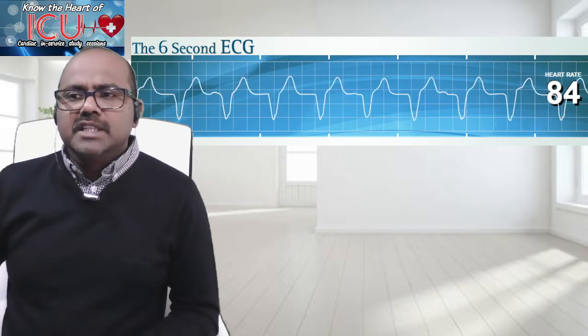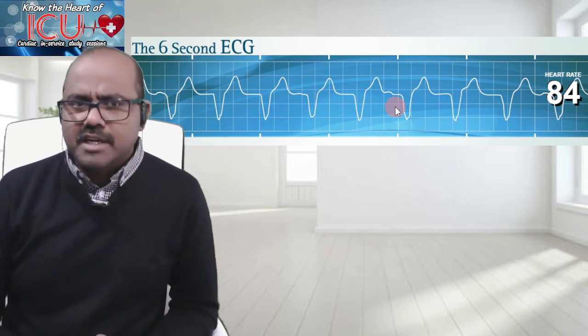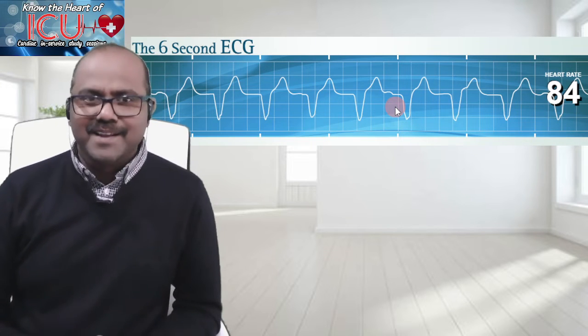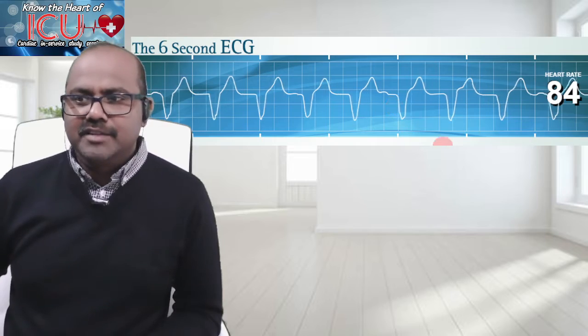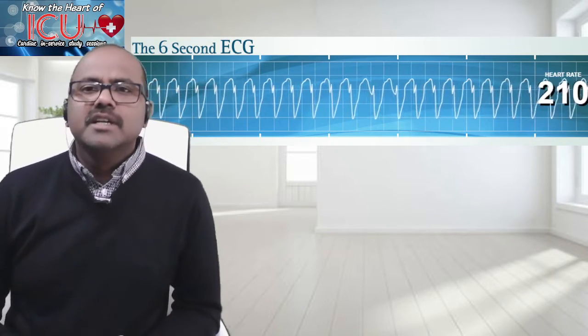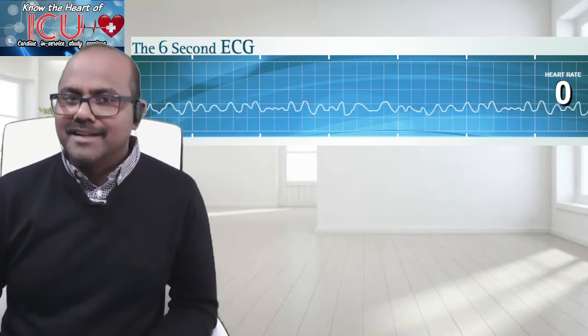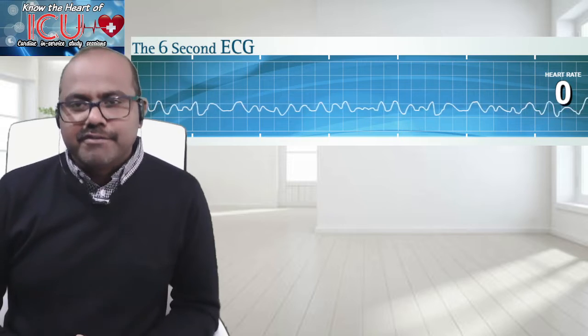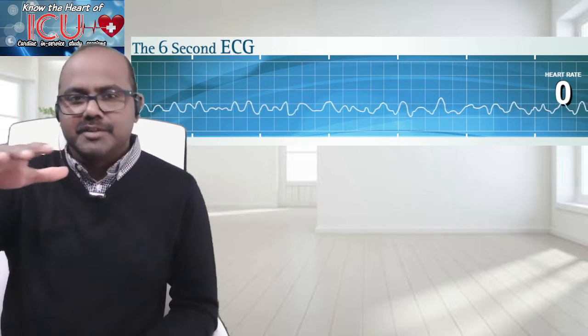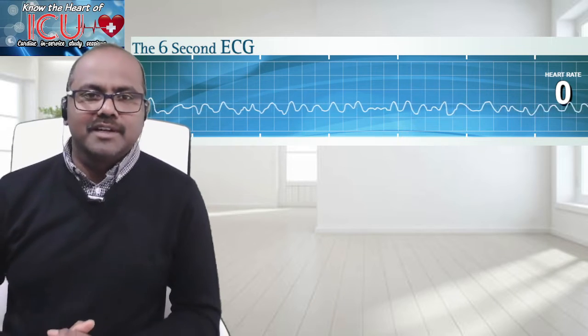If the ventricular rhythm goes at a normal rate, we cannot call this a ventricular tachycardia because it's not a tachycardia. So it's an accelerated ventricular rhythm. But if it goes as a tachycardia, if it goes more than 100, we call it a ventricular tachycardia. And you have your final kind of rhythm, that's your ventricular fibrillation. So it's fibrillatory waves only. So this is how we are actually recognizing the rhythm.